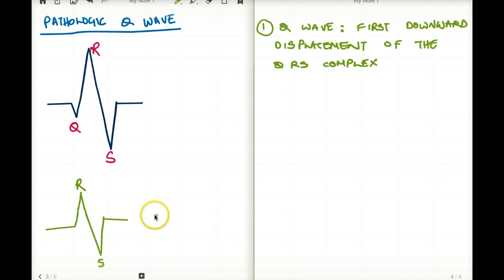What if the EKG looks like this? After a P wave, this is all you see. What is this wave going to be? We know that both Q wave and S wave have negative deflection. What kind of wave is this one? It is a little confusing, right? We don't know which one is which. We have two negative deflections, a Q wave and an S wave. Therefore, this kind of wave is called a QS wave.